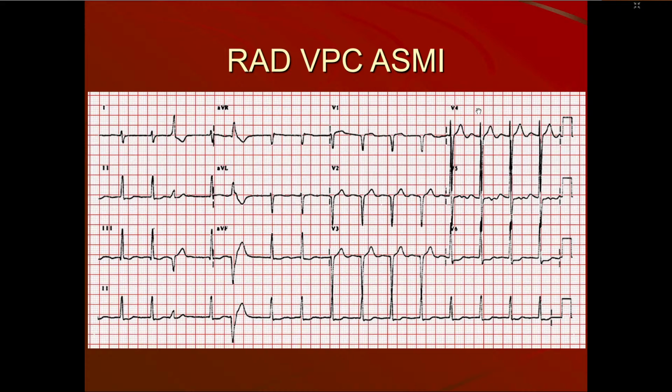What else will you see in the ECG? I can't say only the MI changes. We have to interpret the ECG in totality. So this is a VPC, VPC, VPC. Here see, this is a positive R, VPC is negative. Then this is ST depression and T is upright. So these are the findings.